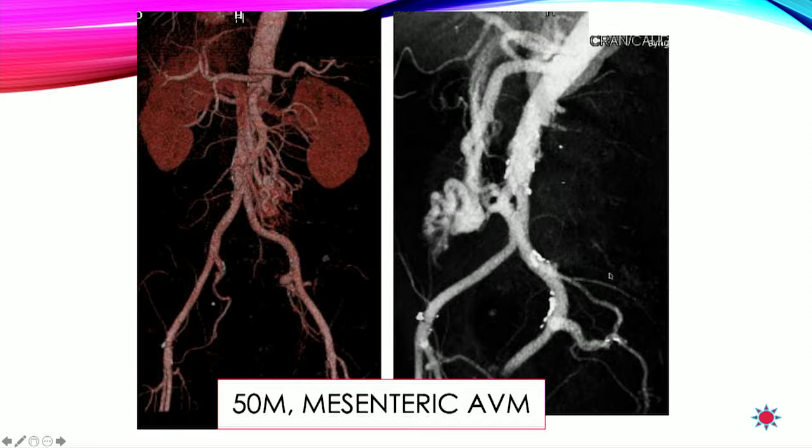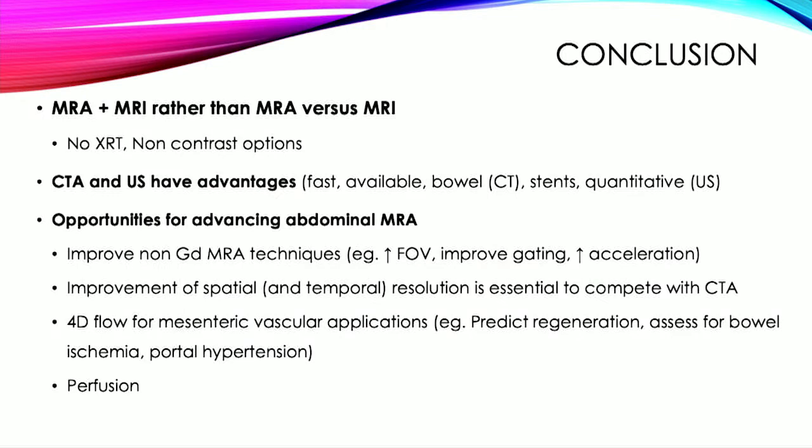And this is an example of a vascular malformation, an arteriovenous malformation. These are very important to be able to recognize, and the best way to do it is with the dynamic imaging that we have with MRI and time-resolved imaging, to appreciate and differentiate between a high-flow and low-flow lesion. While this may be somewhat obvious in this case, sometimes it's much more subtle, especially when it's in other parts of the body. And this can lead to heart failure and other steal phenomena.